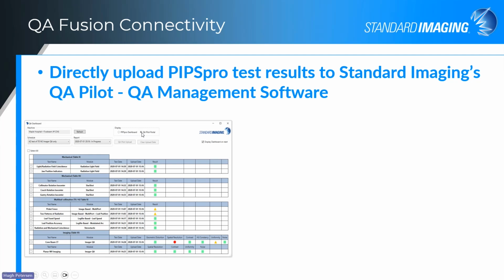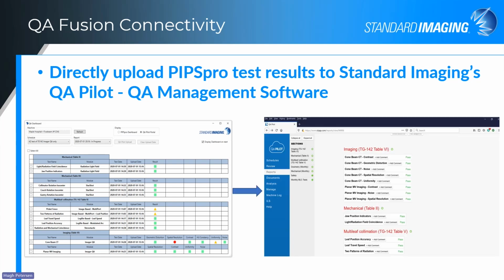And you'll see the ability now, they'll still show you all the tests, but now you have the ability to select what tests you want to have pulled automatically right into QA Pilot. So here I've got my different test results. I can go ahead and pick and choose what tests I want to push, and from there I will go into QA Pilot. It will give you a quick overview there.